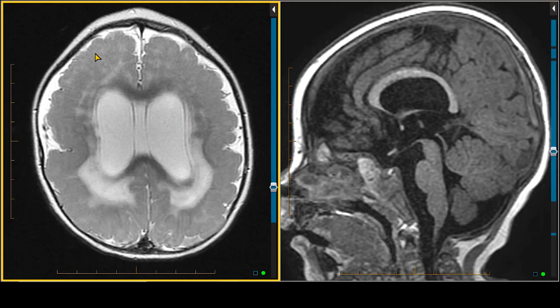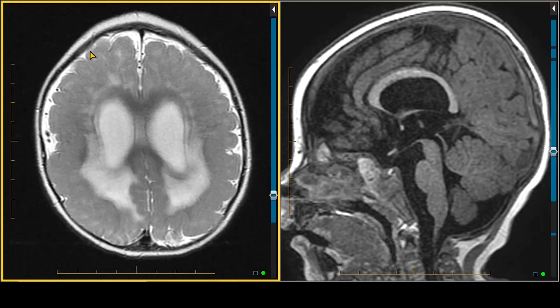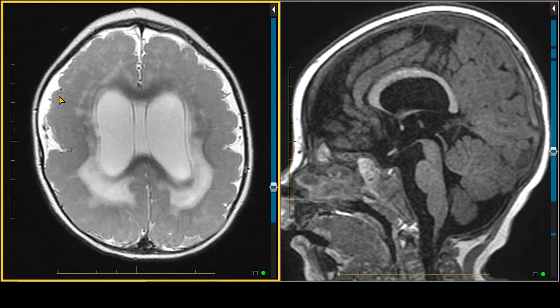In addition to that white matter injury, we're seeing an abnormal sulcation pattern. We're seeing shallow, narrowly spaced gyri. This is polymicrogyria. Now, it's a little more challenging to see in this case where there's, first of all, myelination in a 1-year-old is not as much as it was in the other cases. Secondly, there's diffuse white matter injury. So that makes seeing the polymicrogyria a little bit more challenging.